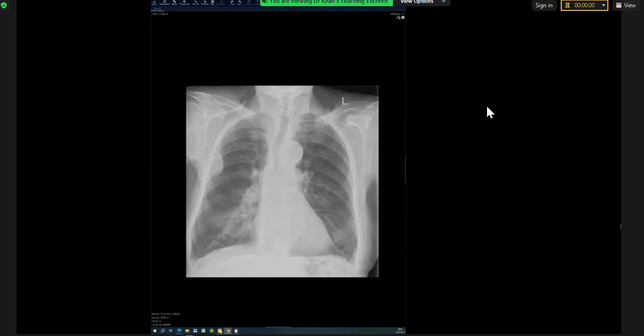Post-lung fibrosis, why not TB? It can be TB. In TB, when you get fibrosis like that, the lung has cavitation. The lung has a lot more asymmetrical scarring. You get bronchiectasis, you get scarring and cavitation. So I can show you a case next time for TB to put it side by side so you can appreciate it. But yes, purely on X-ray, yes, you can talk about TB. But when it comes to that CT, you should think of sarcoidosis only.